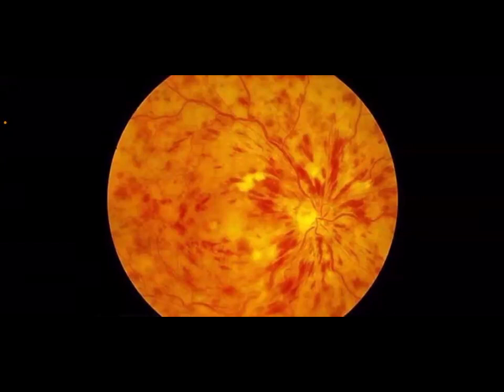atrophy. If you can see the blood vessels gathered and heading toward the center of the optic disc, but you cannot identify the margins of the optic disc, and there is swelling, congestion, some hemorrhage, and the patient is hypertensive, this is most likely papilledema. So, optic atrophy and papilledema.